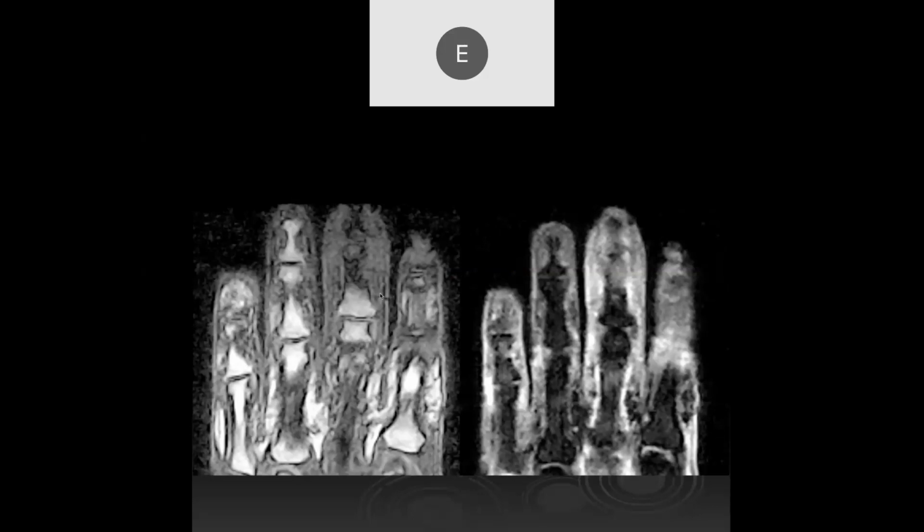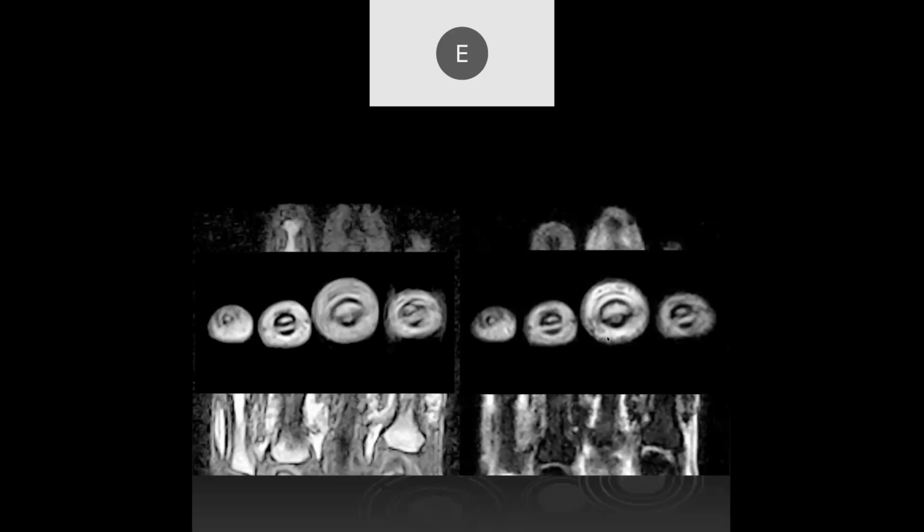Right, so we see circumferential swelling about that long finger, and the DIP joint looks like there's maybe some bone erosions, bone edema. Yeah, right. Concern for psoriatic arthritis and dactylitis.